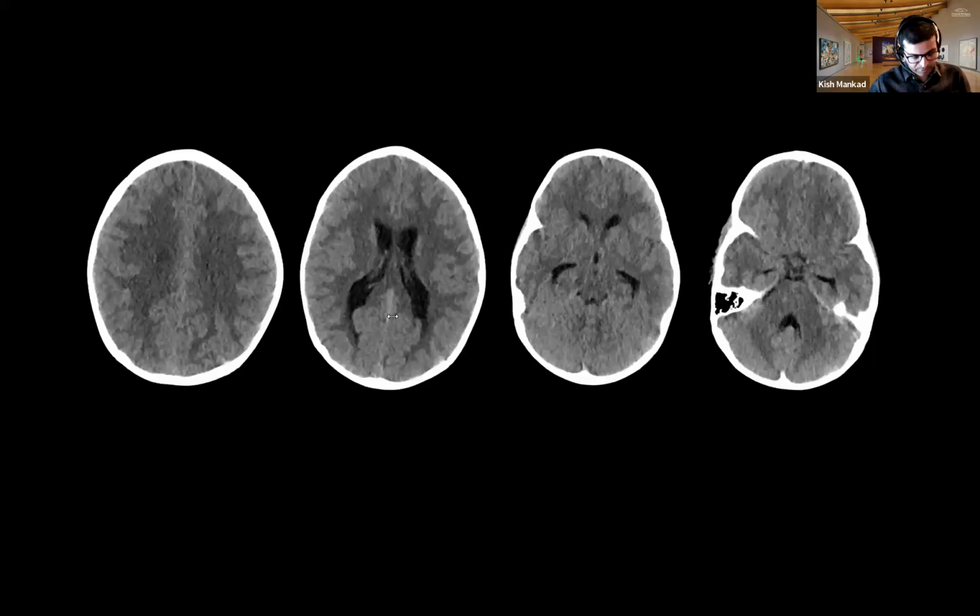But what is hydrocephalus? We look at hydrocephalus, we think big ventricles equals hydrocephalus, isn't it? So you have to decide if these ventricles are big or not. And Hamad, you have given a very diplomatic answer by saying any signs of high intracranial pressure. So you're using imaging to evaluate pressure in the brain, and that's very, very difficult. And Dr. Sami says herniation, and there are no herniations going on here. Ballooning of the ventricles, you can see why this is difficult even for a radiologist, definitely for a clinician, because all these manifestations happen a little bit later.